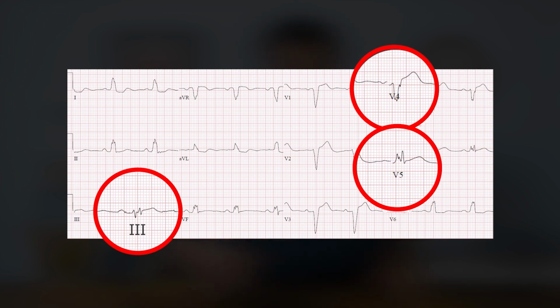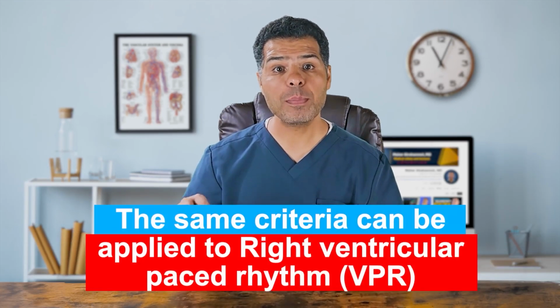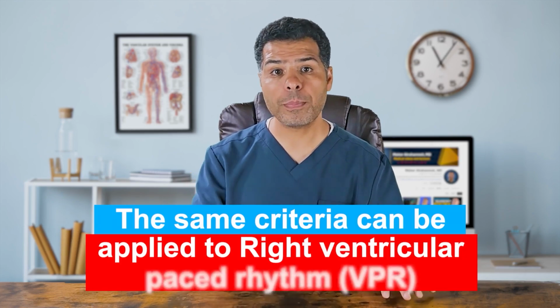Instead, it's slightly elevated. This patient was taken to the cath lab after initial resistance from the cardiologist and was found to have a 100% mid-LAD occlusion and 90 to 95% RCA occlusion. The same criteria can be applied to right ventricular pace rhythm.